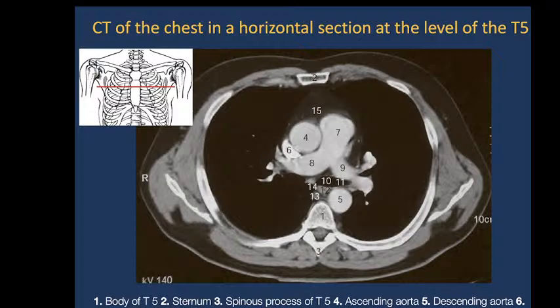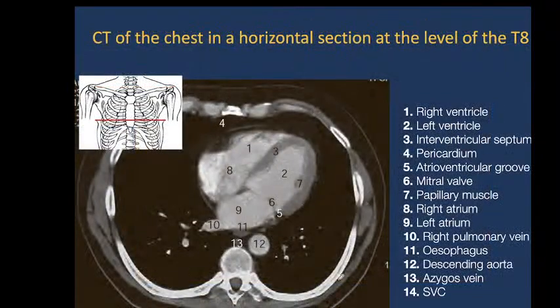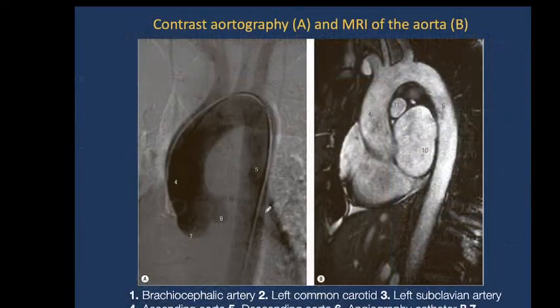Sorry. I had to talk with Anna Walterovna. And next picture is the inferior level of the horizontal section, and you see also different chambers, heart chambers, as well as the interventricular septum. We have just talked about this structure.